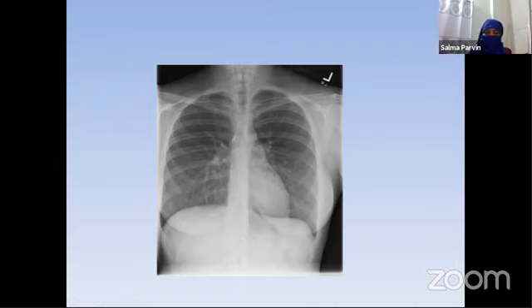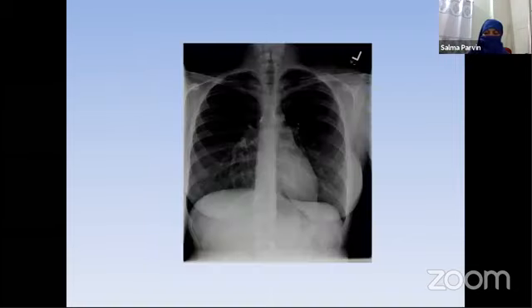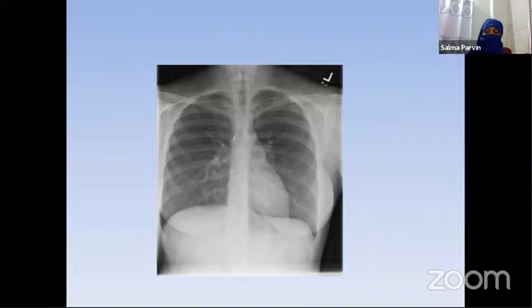You see, this is an X-ray film. This X-ray film has a thoracic dimension with the cardiac shadow to the left of the spine, and the chest film has vasculature seen at the center and also at the periphery.